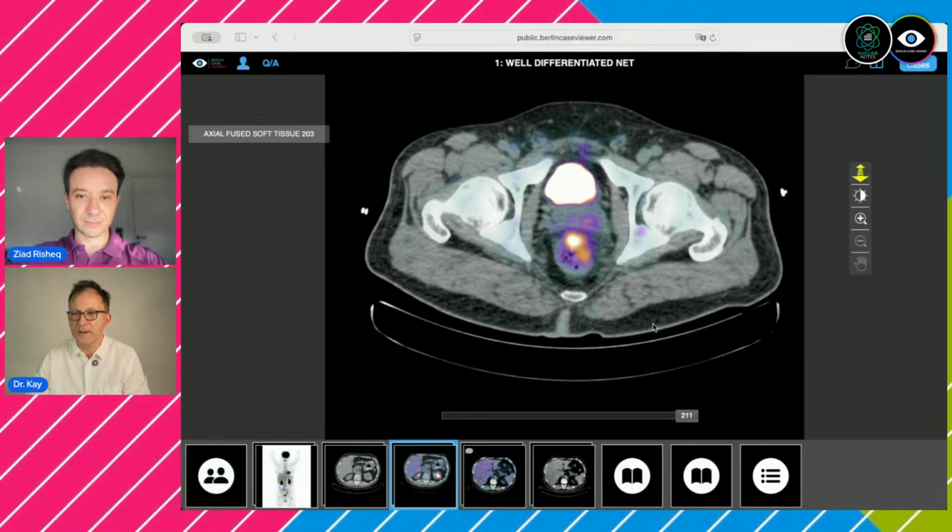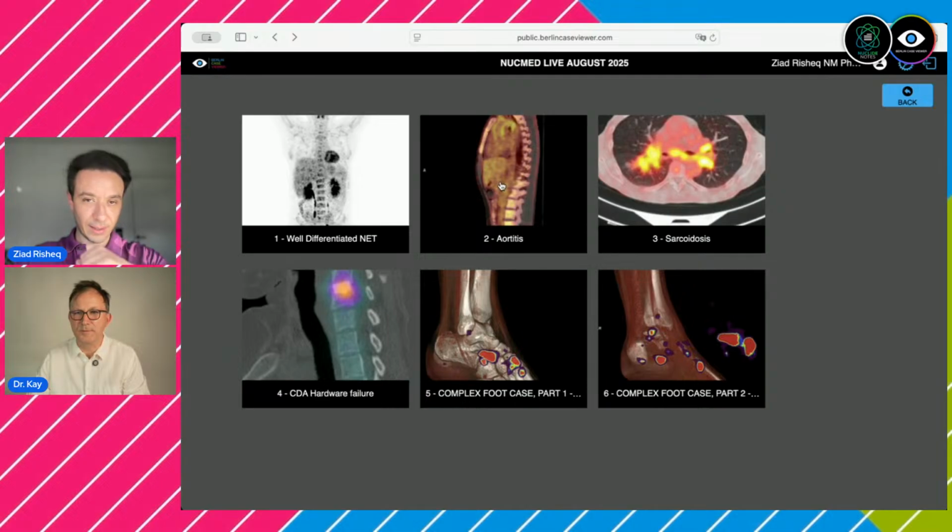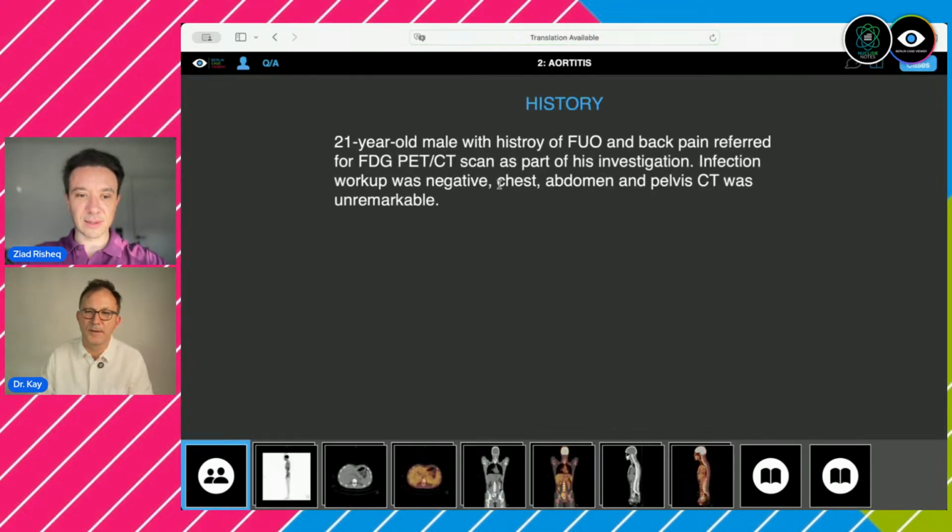Okay. So I think it's worthwhile to go to the second case because time is running. Yeah. This is what I was afraid was going to happen. So, okay. This is a nice case. Actually, I had this case a couple of days ago. We're going to go through this quickly.